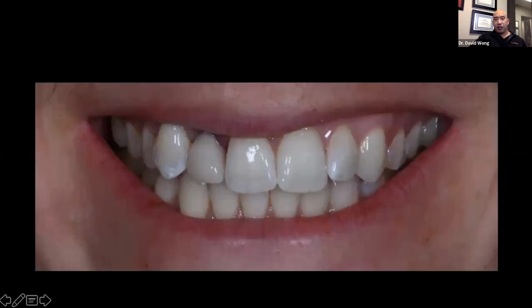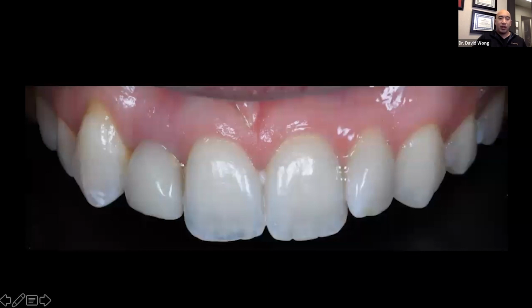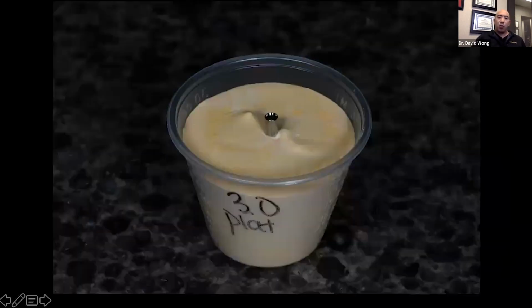As you can see here, this is immediately right after placement. This is 4 months later. And then I've got 6 minutes, so I'm going to walk you through this.